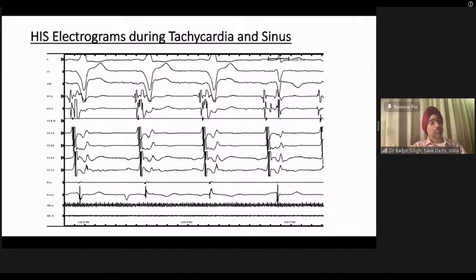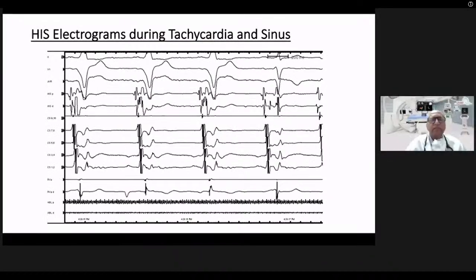Very, very important, because the only thing is the antegrade pathway seems to be either previously ablated or whatever it is. If it's a robust pathway, right-sided pathways usually have a manifest pre-excitation. To have this intermittent sinus rhythm with a narrow QRS indicates that it's not a very robust conducting pathway in the antegrade direction. But the tachycardia can be very rapid in these situations. So, as we said earlier, it's extremely important.